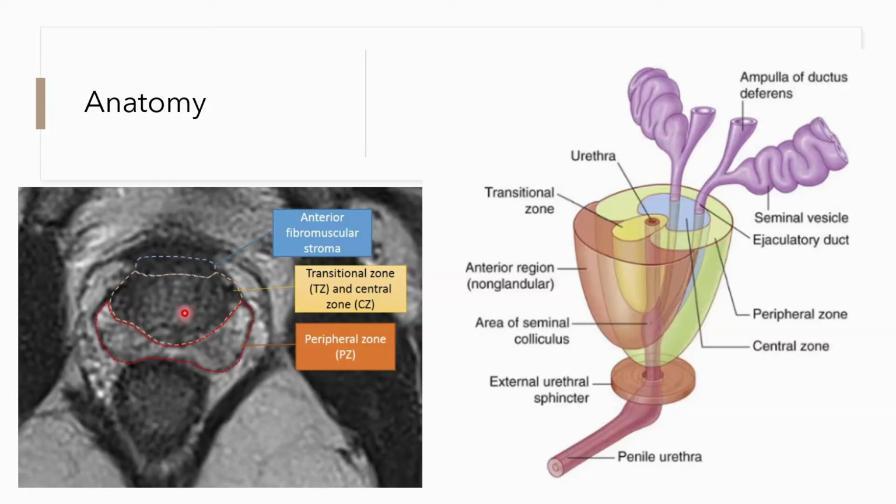However, when there is a prostate cancer in the peripheral zone, there will be hypointensity in this area. So the prostate cancer bearing areas will appear darker. So this is an important thing to understand, because we need to identify the region where there is prostate cancer in the MRI images if we are to contour properly.